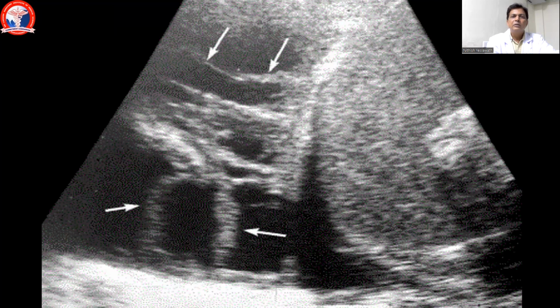This is an ultrasound image. This is liver and diaphragm. Above part is pleural space. So here a large pleural effusion is seen with multiple septations, and largely anechoic areas are seen. There are a few areas where the echoes are reflected back, as a few echoes are seen. So this is secondary to turbidity. So this is a case of empyema on ultrasound we are seeing.